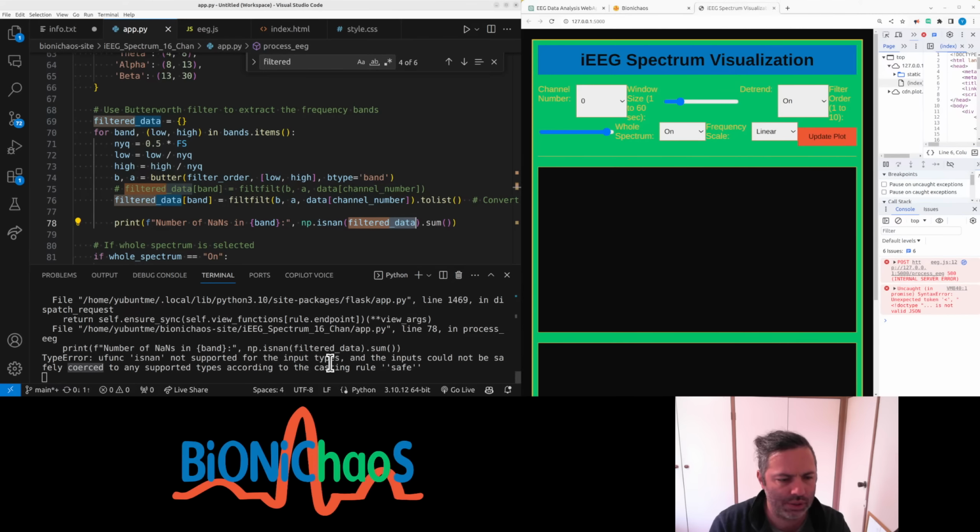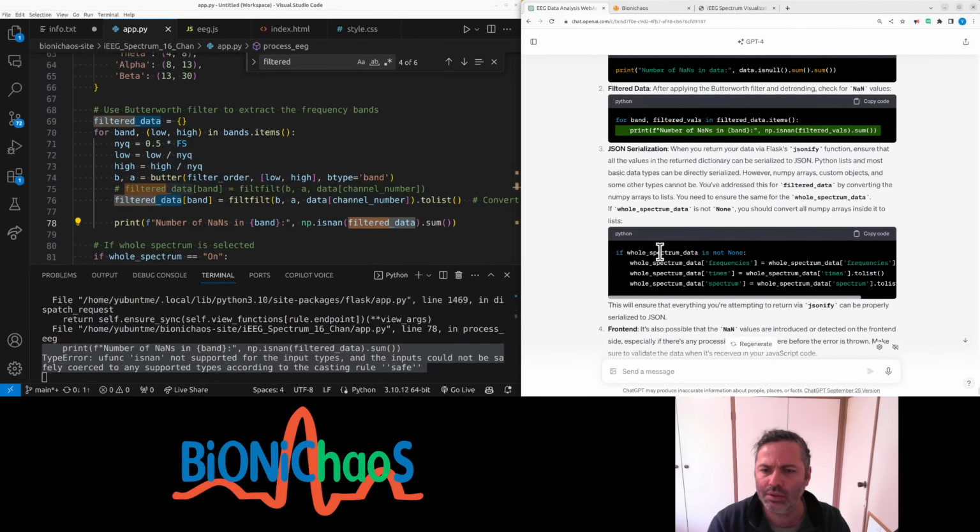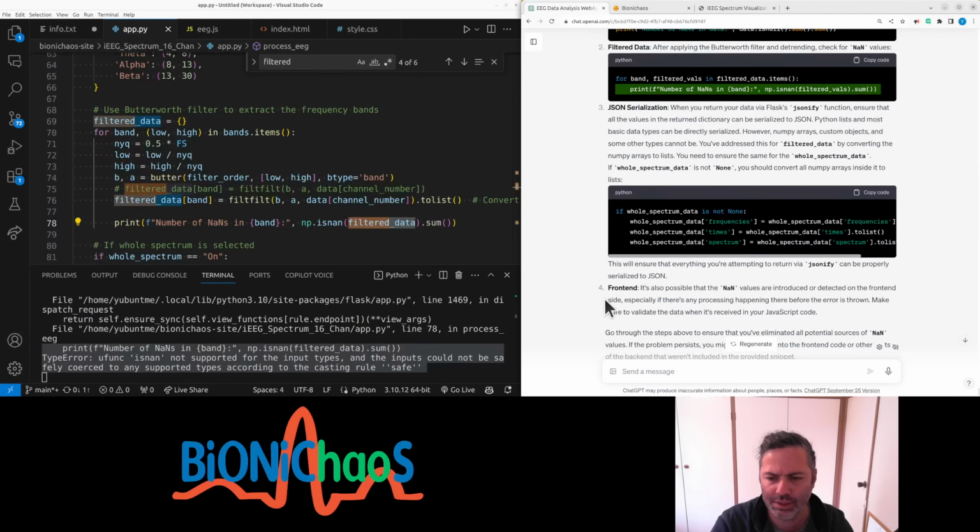This didn't work. Convert all the way to the list. I'm pretty sure we're already doing this. Is the process? I don't think there's any processing on the front end. I don't know what it's talking about.